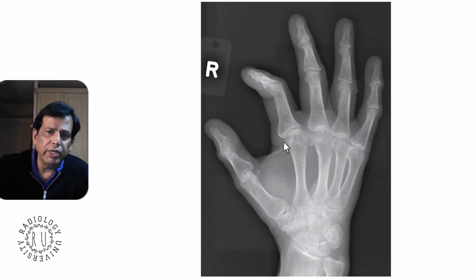So in this case, the teaching is if you get a hook osteophyte in the second, third MCP joint involvement, think of hemochromatosis. Look for the TFCC, whether there is calcification, because these are all iron deposits in the soft tissue, a chronic iron deposit disorder, which can cause calcification and hook osteophyte. Involvement of MCP second, third, fourth, fifth. Second, third, fourth is common.